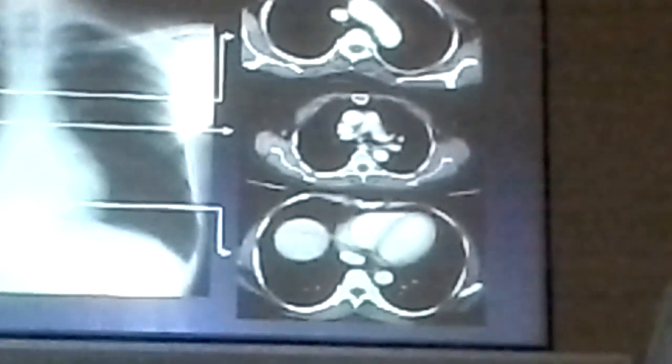This one is the spine, and these structures are scapula. At this axial level, what is this? Yes, this is the liver, and the dome of the diaphragm has come up over here. And what about this? This is the right ventricle. Posterior to the right ventricle is the left ventricle. What is this? Very good. Here is the inferior vena cava. And this is the descending aorta. So this is the arch, descending aorta, and again descending.